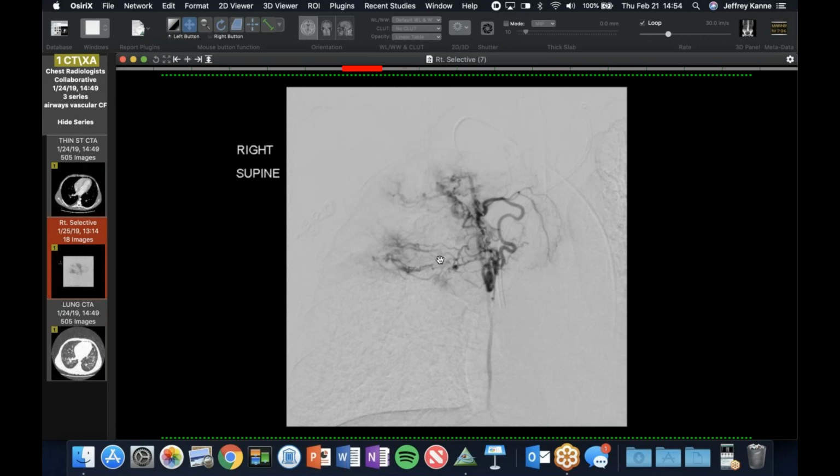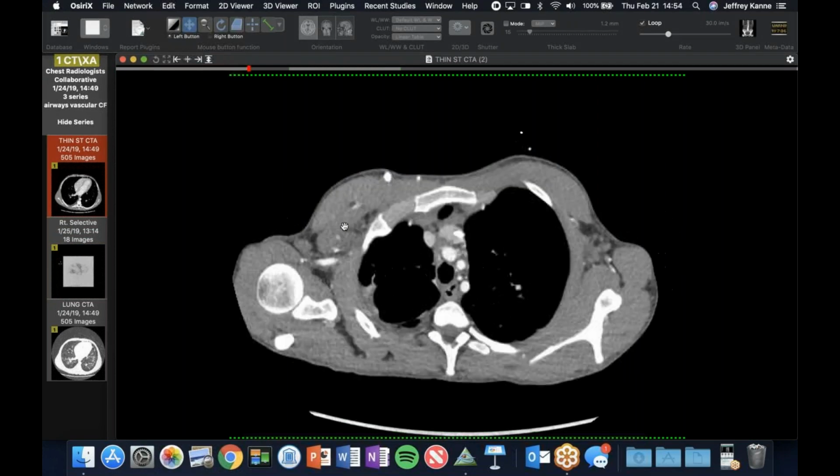And I presume that they're high pressure, there's chronic inflammation, the walls will get compromised and or infected or something, and there's a little tissue breakdown, or there's lots of vigorous physiotherapy as well to try to clear these airways that maybe they ooze or leak, and patients can come in like this. But so CT, if you get a good aortic phase, can be helpful.